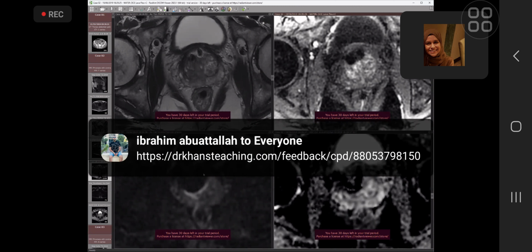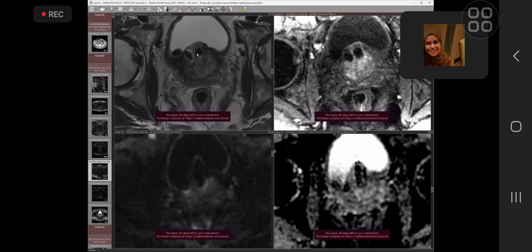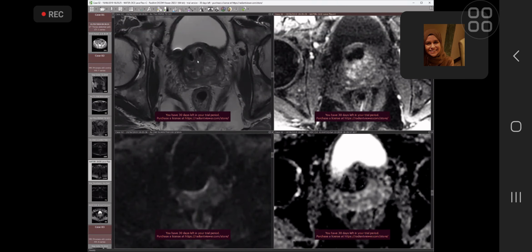So it is of low signal intensity in T1, and again low signal intensity. It's calcification, I think. But how would you describe it? Not rather than what's causing it. What do you think? Yeah, it is two foci of signal void in T1, T2 with no restricted diffusion.